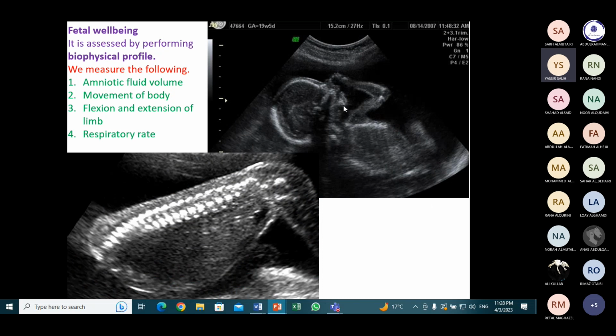Also, with ultrasound you can see a well organized fetus. You can see the upper limbs, even the humerus, the arm and forearm, and the head, the mouth, the lower limbs, the spine, the chest and the ribs. These are the ribs, and this is the fetus in the uterine pregnancy. You can see the spine, the lower limbs, the thorax and the abdomen, and this is amniotic fluid. This is the fluid.